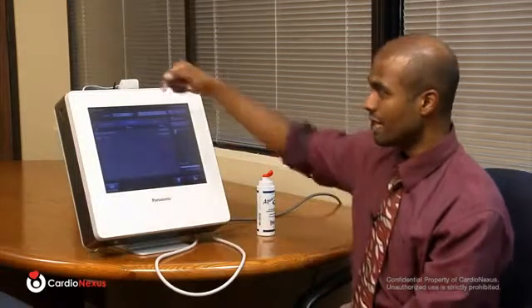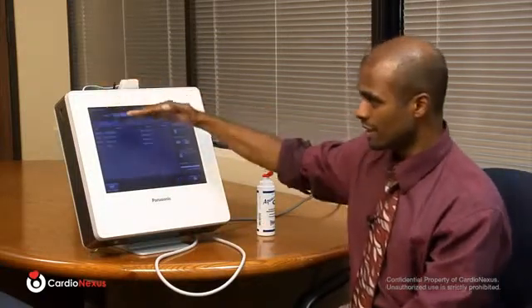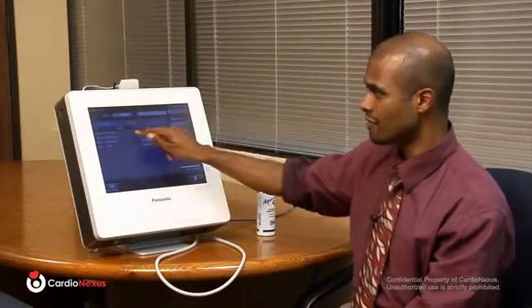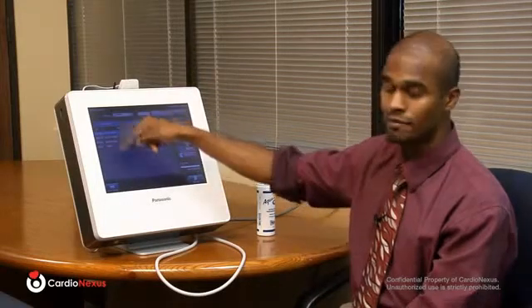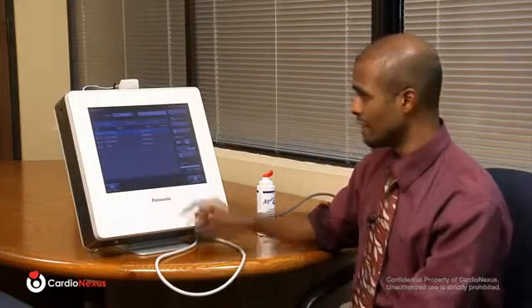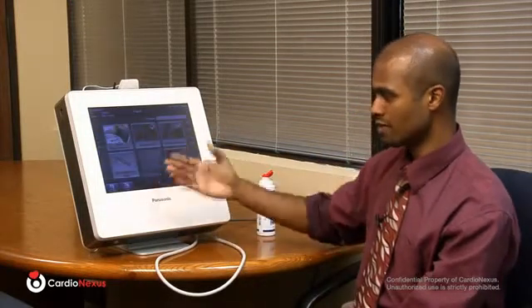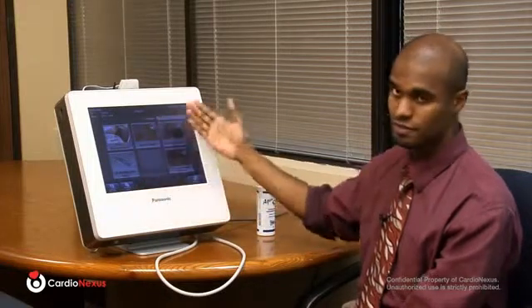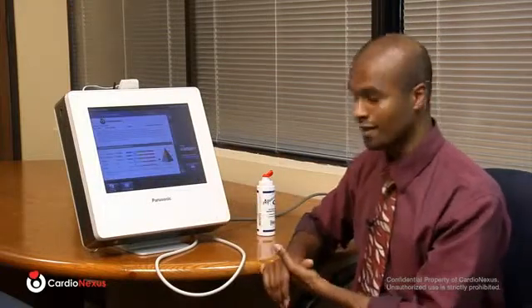You have 3 tabs. You have one for completed tests. Now I'll choose completed, and you'll see the completed tests that we have stored in the machine. And the very first one that I've done today, this can be sorted by date, by name, by subject ID. It's extremely searchable in that manner. Simply choose the test, choose review to go back and either review patient information or specific information about that person, or again, clicking report will give you that overall assessment again.